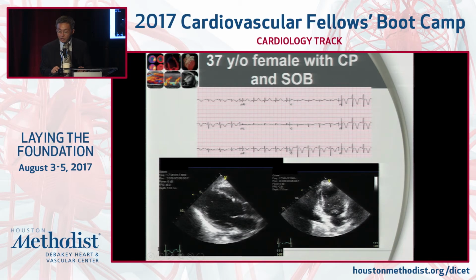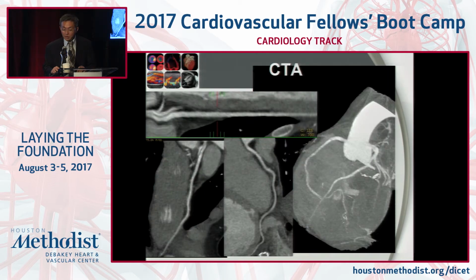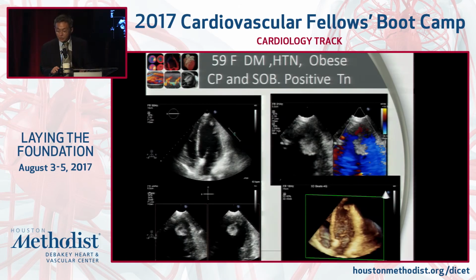Echo, take my word, shows EF in the 20s. Whole anterior, whole 2/3 distal of the LV is not moving. Right now, most likely it's due to stress cardiomyopathy or Takotsubo, which was the case. Her coronary CTA is completely normal.